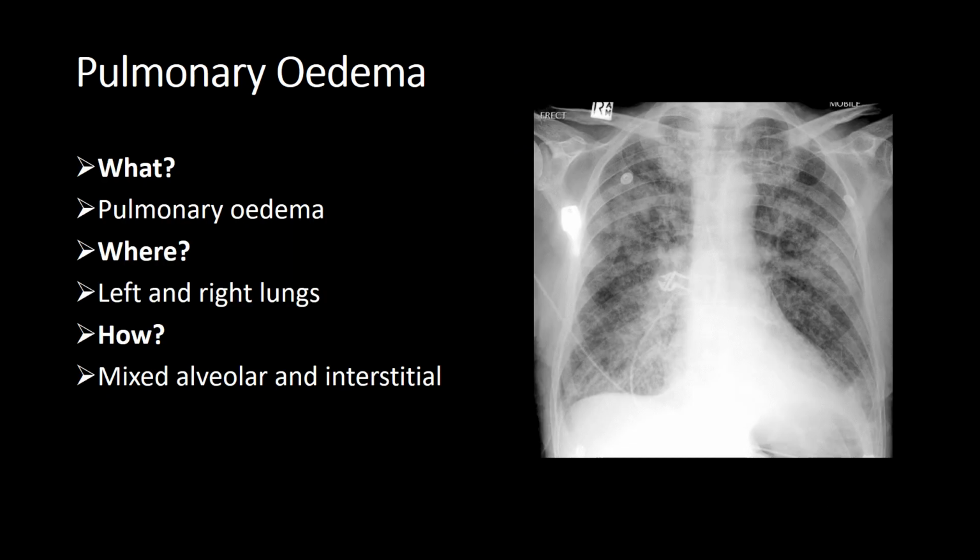So what is it? It's pulmonary edema. Where? Left and right lungs. How? Mixed alveolar and interstitial.